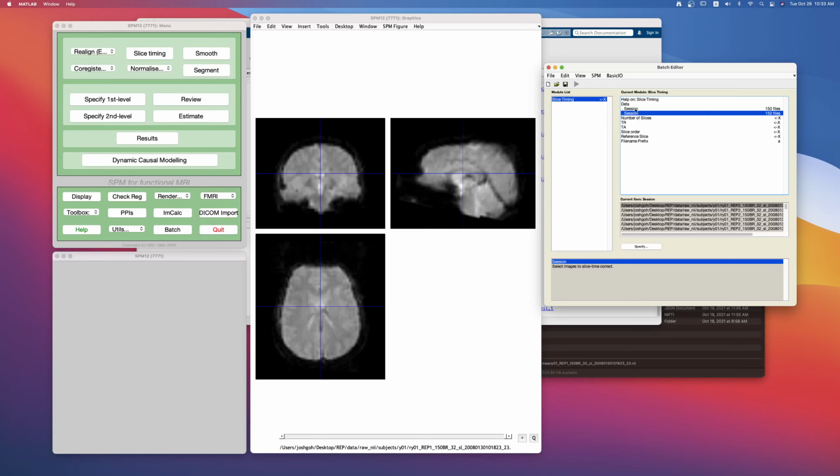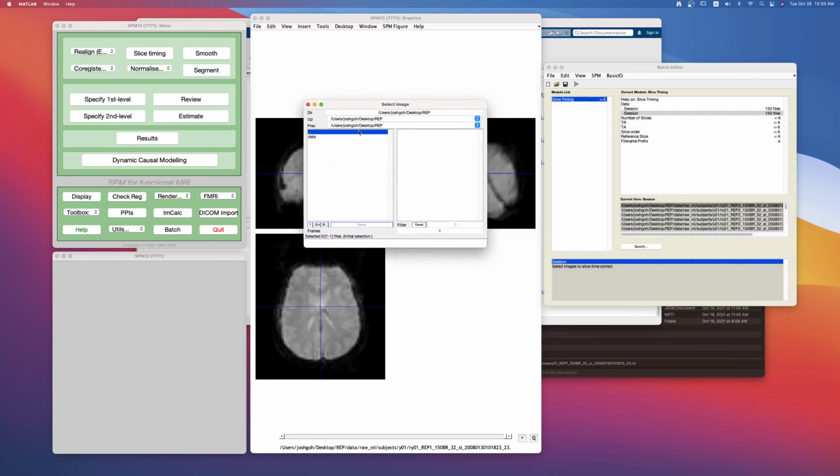At any time, this is also to show you, if at any time you need to review this information, it's okay to pause, figure things out first, think of where you can get such information, and then get it, and then fill in the details. So we know that previously when we use display, it's going to have this window out. We could see how many slices there are, right?